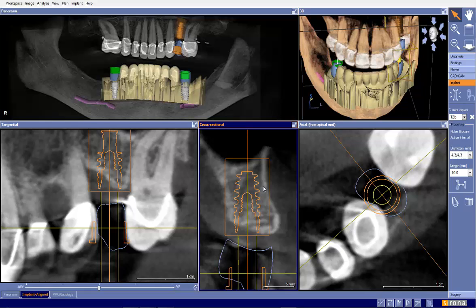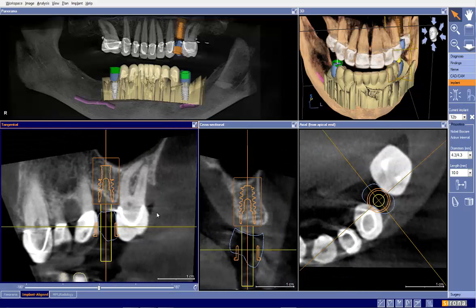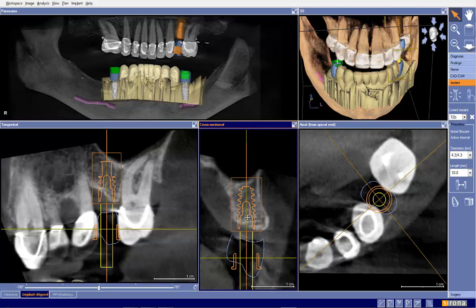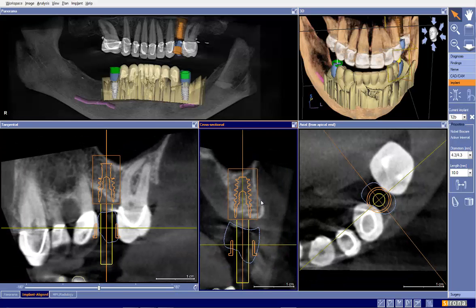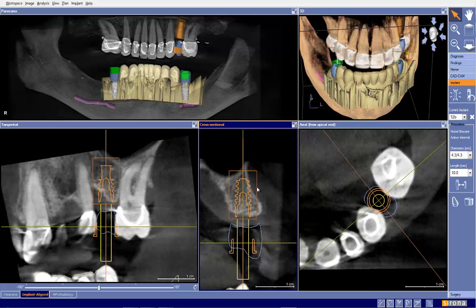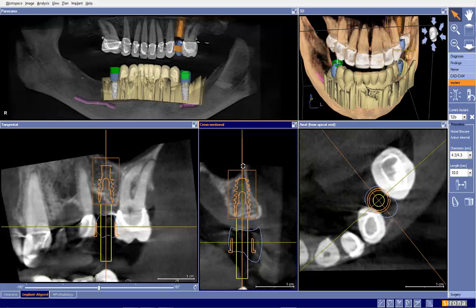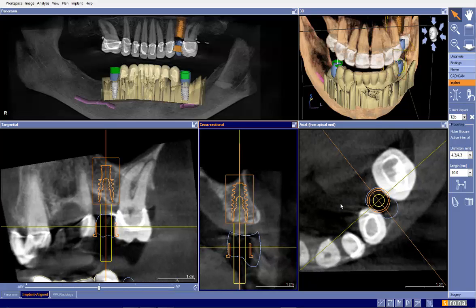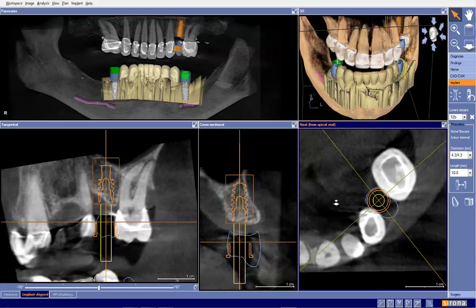Now the more complicated implant comes in the upper left-hand side, tooth number 13 or 12B or whatever we want to call it. There are some philosophical concerns with this particular implant. First, we're coming out of the buccal cusp, so in an ideal world, I would probably tilt this like so. We will need to graft this site, as we should expect with a tooth that's been lost for a very long time. The good news is this is a relatively straightforward grafting site.